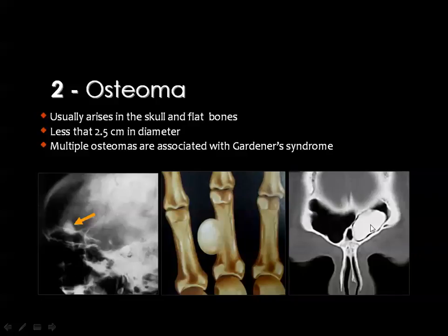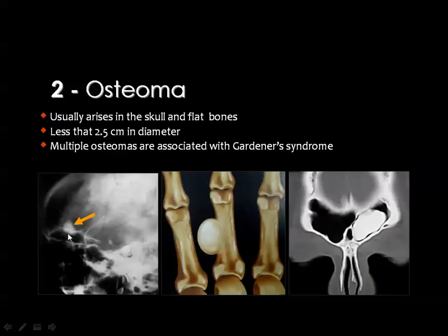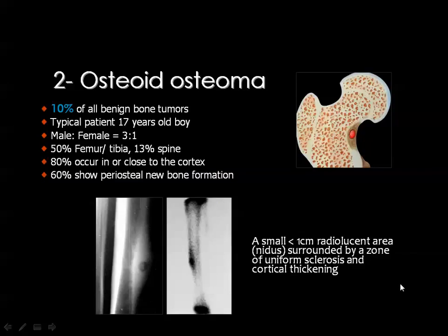You see here an osteoma in the frontal sinus, and this is also an osteoma in the floor of the anterior cranial fossa. This osteoma is solid. There is no cancellous bone inside. There is no medullary cavity inside. This osteoma is, of course, a spot diagnosis whenever you see a lesion like this, and it only represents an osteoma.